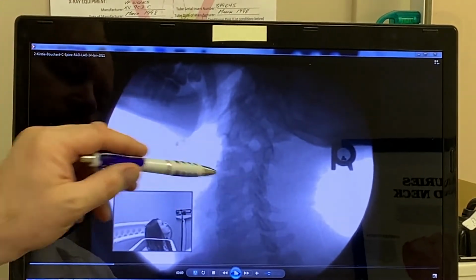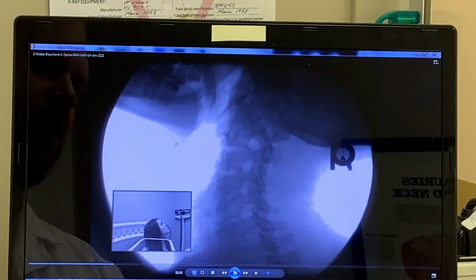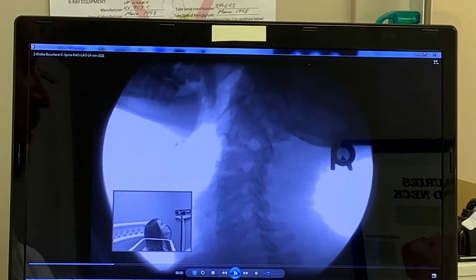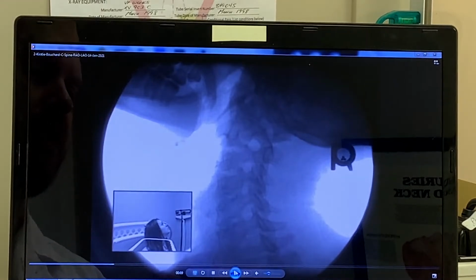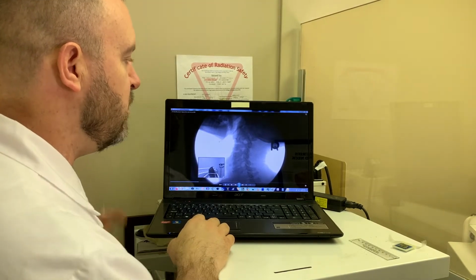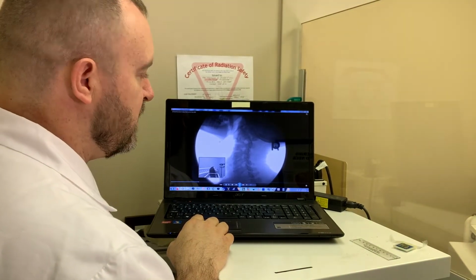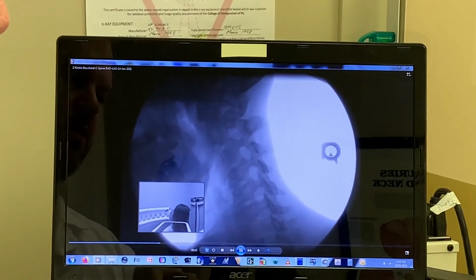So at this level, that opening closes more so than the other levels, which could pose the possibility that the nerve in there will get compressed a little bit in certain positions, but this does not look at the nerves. This just shows that there's a tendency that that could be happening. An MRI would then be able to tell whether that is indeed the case or not. Unfortunately, MRIs are rarely done with positions like that, so it's hard to stress that test to confirm what I'm telling you right now from looking at the soft tissue like an MRI would, because they do everything usually in neutral.